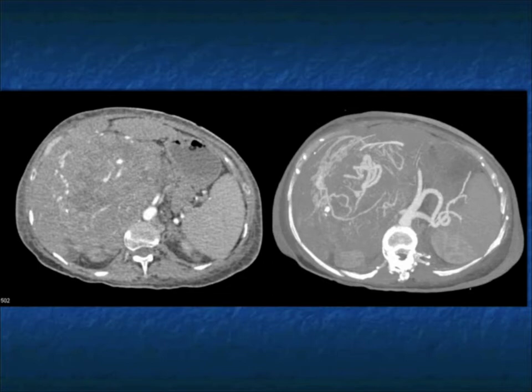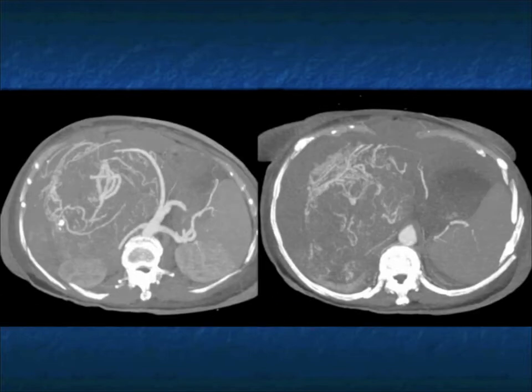Look at that neovascularity. Now remember, we can see abnormal vessels with FNH, but it's a central feeding vessel. You can see abnormal vessels with hepatic adenoma. Often it's a feeding vessel as well, but you can see collateral vessels there as well. And remember, hepatic adenomas can become hepatomas. Cholangios, typically you see vessels displaced. You don't have the vascularity like this.